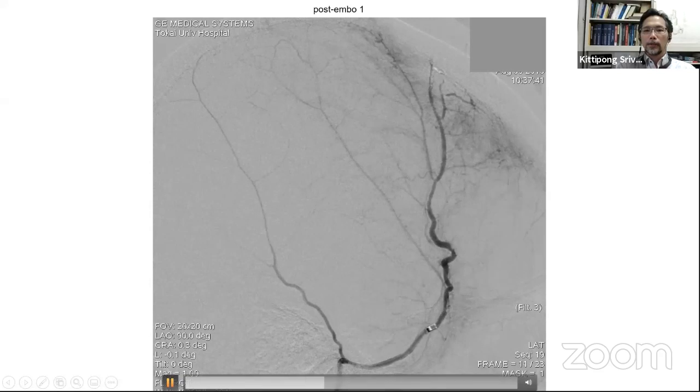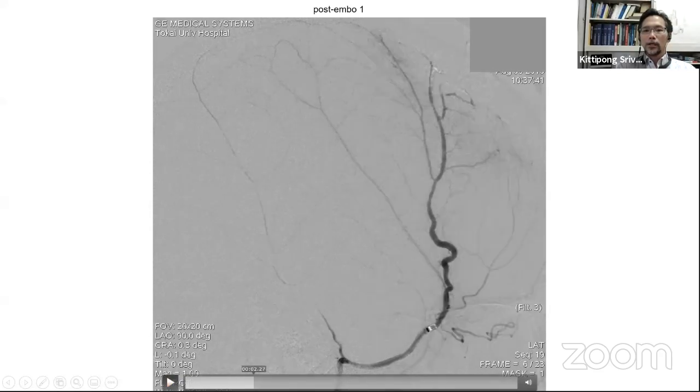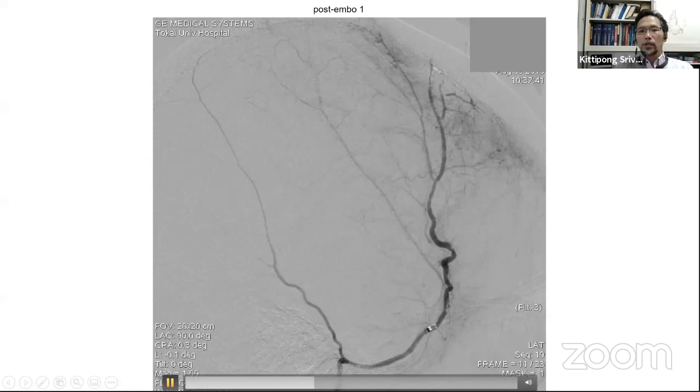Look at this. Okay, you don't see it in every frame, but here. So this is actually the artery that is entering the orbit. It might have some connection to the ophthalmic artery. I'm not absolutely sure, but there's a potential that you can do harm to the ophthalmic artery through this channel. I will play this again. It doesn't show it on every frame.